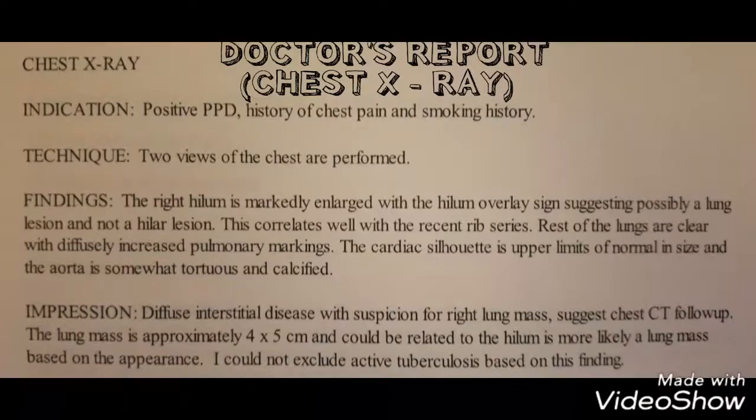Firstly, I will note the lung mass approximation of 4 by 5 centimeters. This term is specific terminology regarding an abnormality of more than 3 centimeters, in which a nodule is less than 3 centimeters. This also corresponds to tumor TNM staging system level T2A.